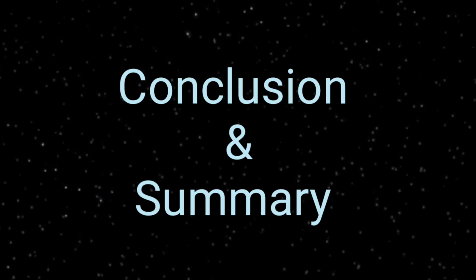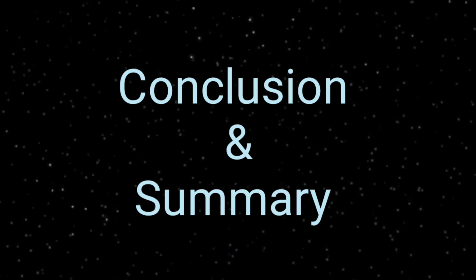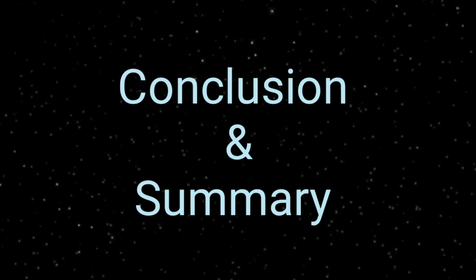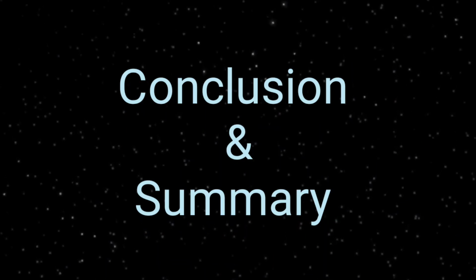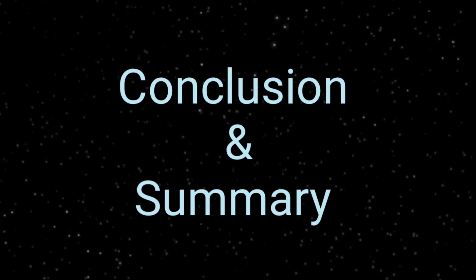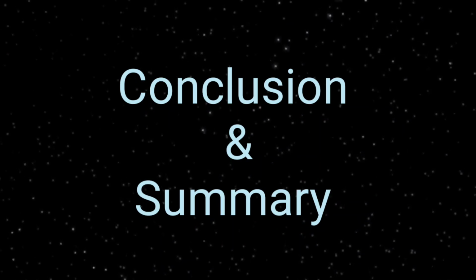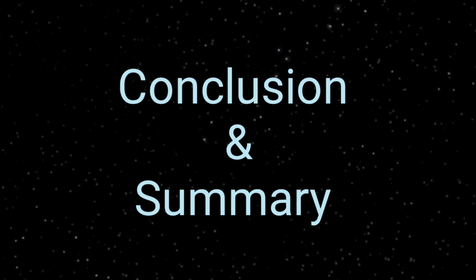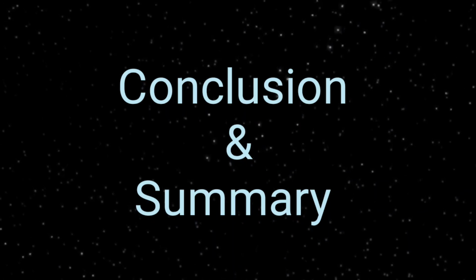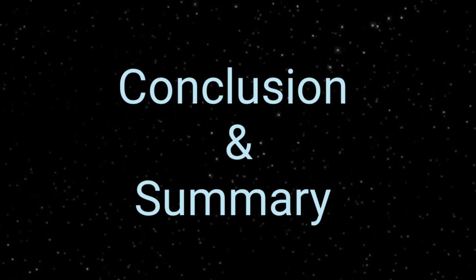So astrocytoma and its multiple grades have been discussed. We have shown you the grade 1 benign pilocytic astrocytoma, or cerebellar pilocytic astrocytoma. Grade 2 has been discussed, and the features of diffuse astrocytoma were quite clear to you on the images. Grade 3, anaplastic astrocytoma, with increased mitotic and anaplastic activity was there, and in grade 4, glioblastoma was also present, and we have shown all these cases.